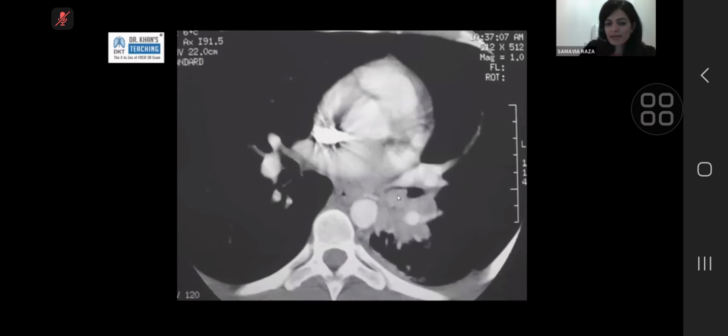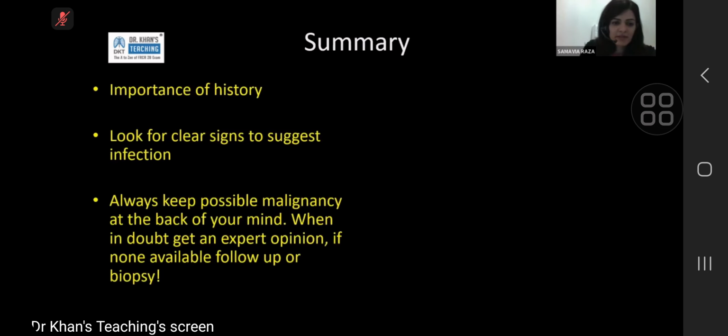So that's M1A disease. Carcinoid is avidly enhancing. Carcinoid is very well defined and very round. And carcinoid doesn't give you pleural involvement like that. So this is a lung primary infiltrating into the bronchus, infiltrating into the pleura, inseparable and likely involving the aorta as well. So that's the summary of today.